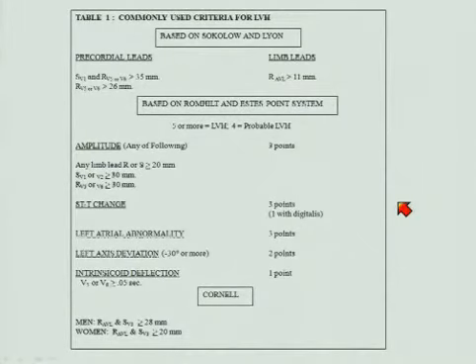There are a number of algorithms for detecting or scoring left ventricular hypertrophy. I've listed two or three of the more common, based on the voltage, in some cases based on points, and adding in these other factors such as the left axis, the intrinsicoid deflection, STT change. I can tell you on the board examination what you would be held to. It would be one that is pretty clear-cut LVH. It's not going to be one that barely makes it by one set of criteria and not by another, and you have to resolve that. That's not going to be a testable point in my estimation. So you will be asked to recognize LVH that is pretty clearly present.